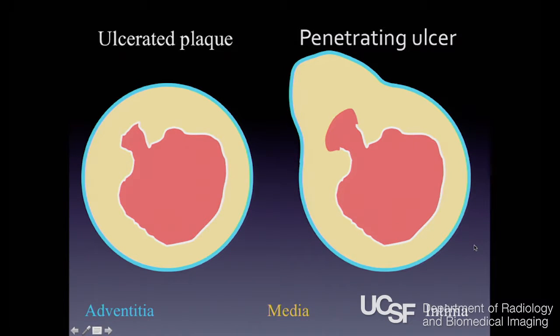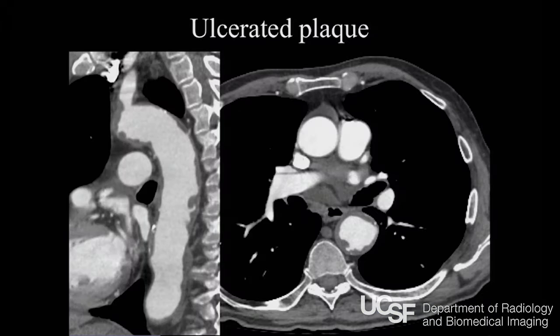What's that external contour of the aorta like? Is it bulged out? In which case we could call it a pseudoaneurysm, right? A little pseudoaneurysm, or is it not? This is an example of extensive ulcerated plaque, which is not going to be a problem per se, but it can be associated with embolic events to various systemic arterial structures, or various structures supplied by the systemic arteries.